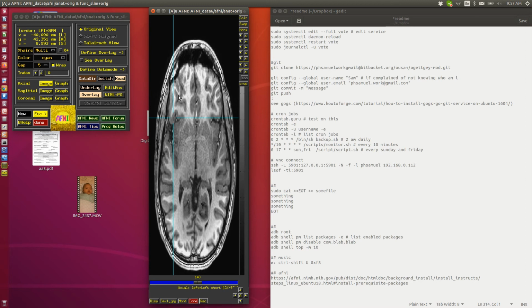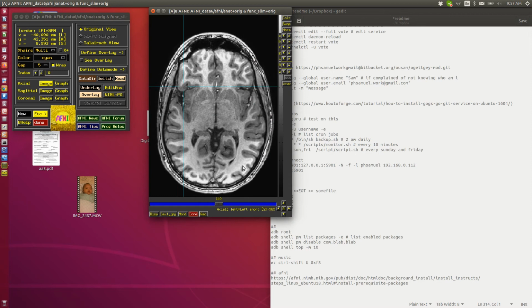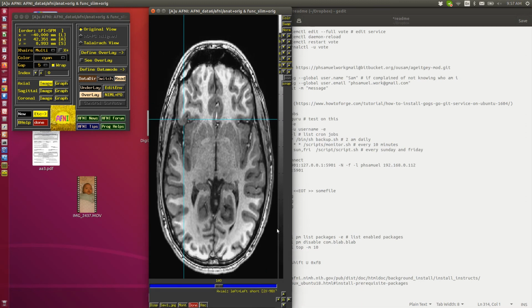The simplest way is to take the cursor, or mouse, or trackpad, move the cursor over this bar that runs vertically next to the image from black to white, and just left click on it. That renormalizes what's called the aspect ratio, the ratio of horizontal to vertical, so it maps to the physical, so the person's brain doesn't look like it's been squished or stretched, which can be amusing, but isn't really very useful.